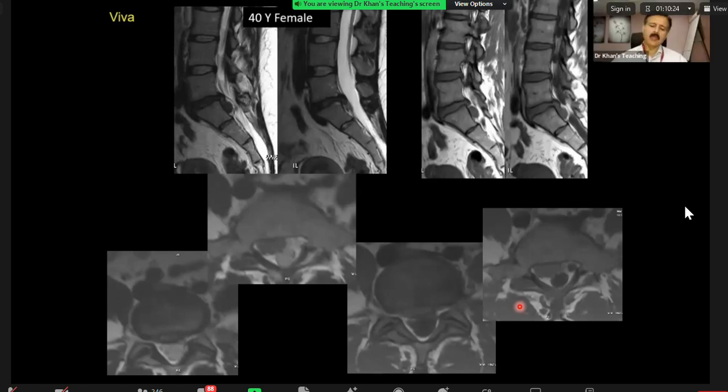Okay. So if you see here, you can read it. I don't have time, but in our ST2 teaching, I will teach this in detail. You know, the nomenclature of disc herniations, and what is a protrusion and what is a broad-based disc protrusion versus a focal or a narrow disc protrusion, and then what is an extrusion, and then extrusions can be with sequestration, as in this case.